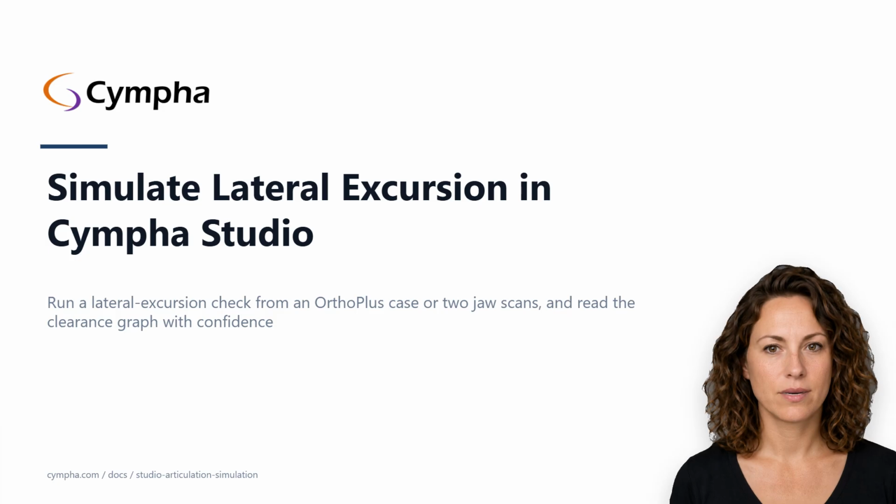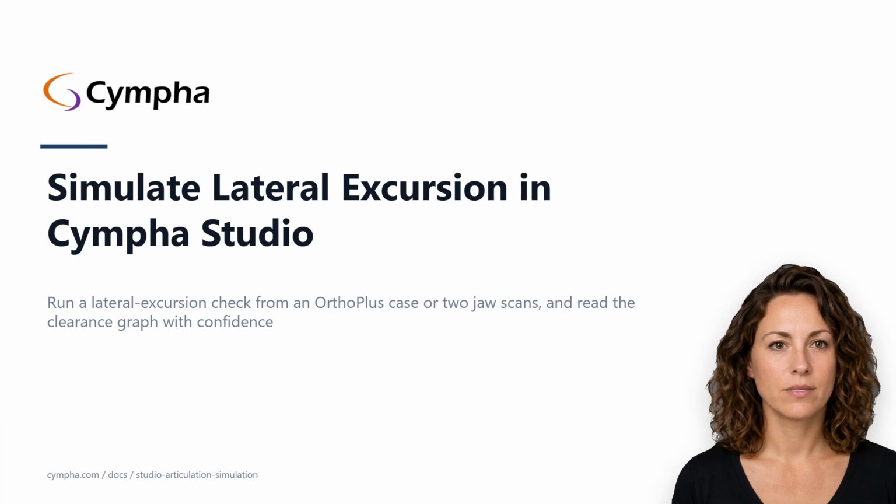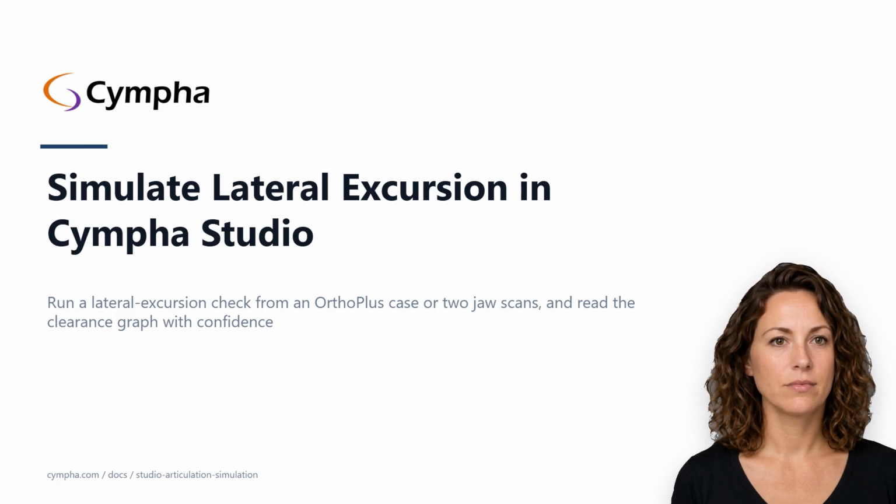The articulation itself takes 5 to 10 minutes once your scans are in. Loading and registering the scans is the part that takes time. Follow along on screen, or listen now and read the written guide later.